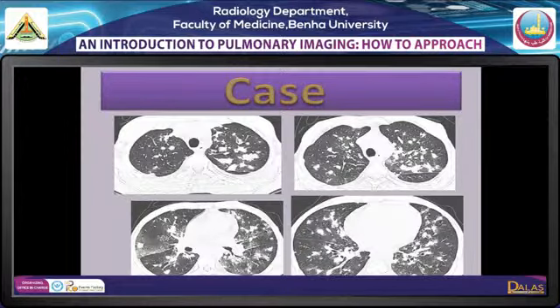فده العيان اللي هحط في دماغي ان لازم ابقى قلقانه من this possibility مع التيبيكال 4 حاجات اللي احنا قلناهم دول: bilaterality, flame shape, pleural base, ground glass opacification and prominent interlobular interstitium. كده 5.